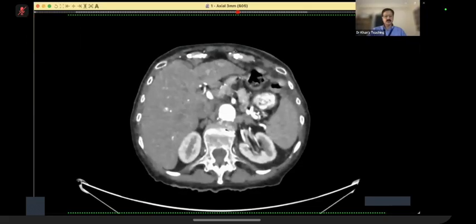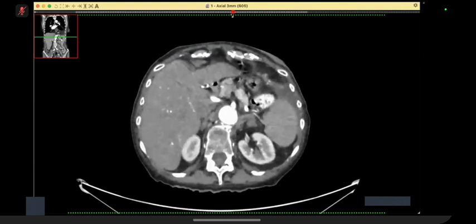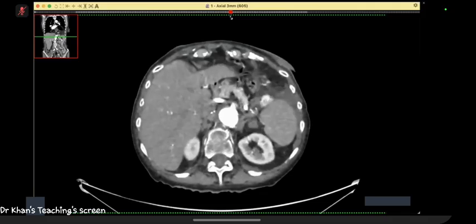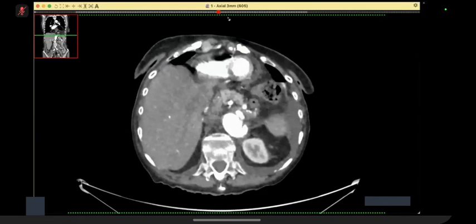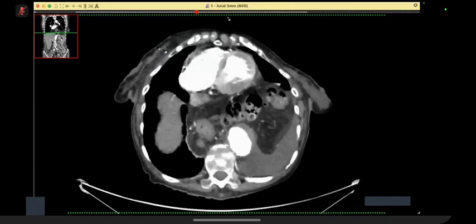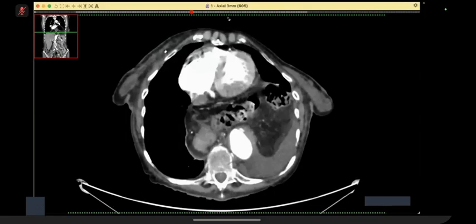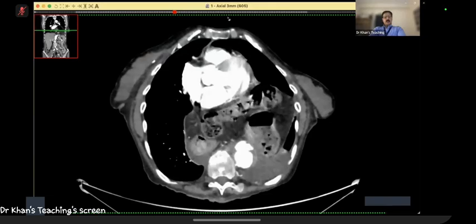Yes, please. Just trying to scroll. Just concentrate on aorta, please.